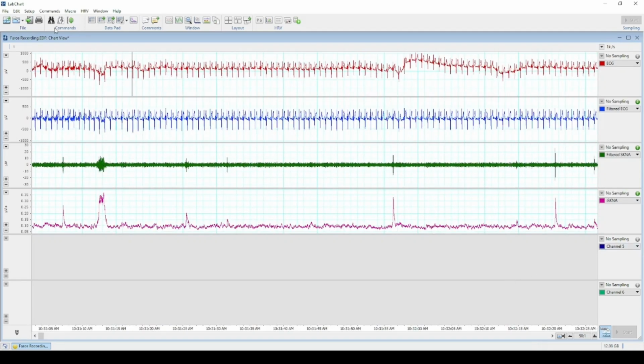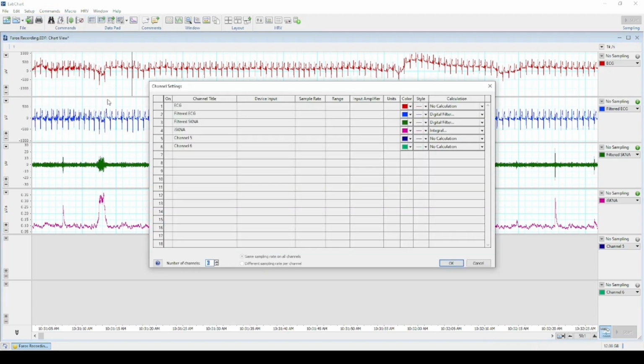And our next channel, we'll set up a channel called average SKNA, which we can denote as ASKNA for short.